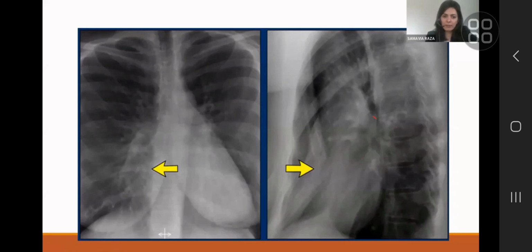You will occasionally be asked to give an opinion, if you are a chest radiologist or a body radiologist, on a lateral view, because an MSK radiologist was reporting the spine and they saw something. And 90% of those abnormalities will be normal structures because of projection.